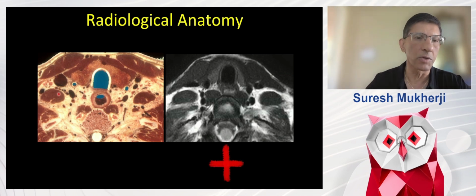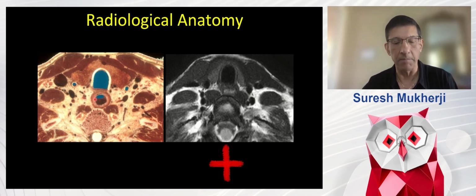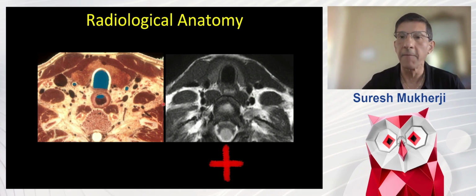Because when you look at the horizontal portion of the cross, there's the anterior scalene, here's the middle scalene, and right between the anterior and the middle scalene muscles is the supraclavicular portion of the brachial plexus on this anatomic image. Now, this is from the Visible Human Project, so they did a beautiful job identifying exactly the beautiful anatomy of the head and neck. And we can, again, see this easily on imaging.